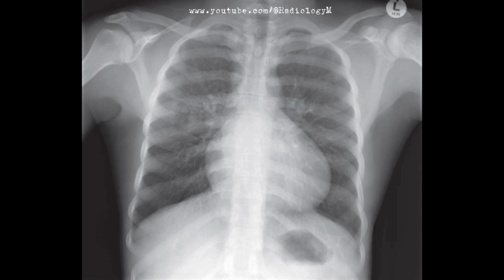As I examine this frontal chest radiograph of a skeletally mature patient, the first finding that catches my attention is the apparent cardiomegaly, suggesting an enlarged heart. Additionally, there is airspace opacification in the right mid-zone of the lung, which I suspect to be of an infective origin, possibly pneumonia. The lungs otherwise appear normal without any significant pleural effusion or pneumothorax.